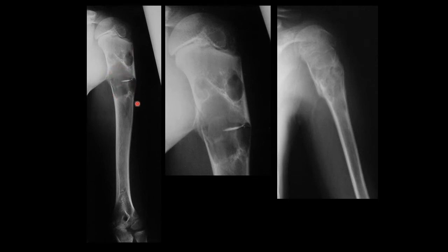And now to decide whether this is soft tissue or fluid, we look at this fallen fragment sign. You can see this fallen fragment sign, which is one of the pieces of bone inside the cavities which has broken off. And when we x-ray the humerus, the child is seated, and there'll be a fluid level, and that bone will lie in the fluid. So the fact that you see this bone indicates that there's fluid in here. And this is an example of a multiloculated bone cyst, and our management would be to curette the tumor out and pack it full of bone graft and get it to heal.